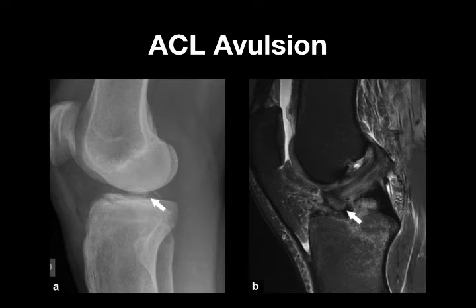After the indirect signs, there may be various direct signs of avulsion fractures in knee radiographs. Avulsion fractures can occur because of ligamentous avulsion or because of avulsion with muscle pull. Most commonly seen are the ACL avulsion fracture and PCL avulsion fracture. These cruciate avulsion fractures usually occur at the tibial insertion, and this picture shows an ACL avulsion fracture, which may sometimes be so subtle that we may miss this injury.